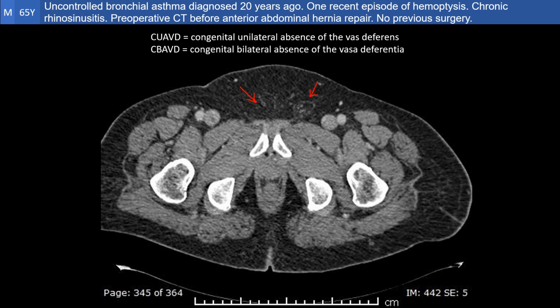In fact, this 65-year-old patient has already had children, although his vasa deferentia are nearly non-existing on the present CT. This means that they have been patent and functioning and normal in his adult life, and that the process has been an acquired sort of atrophy.